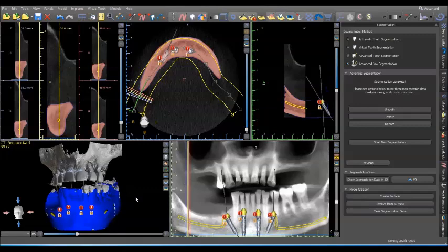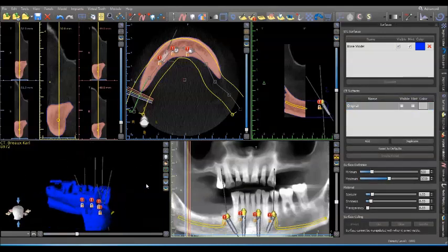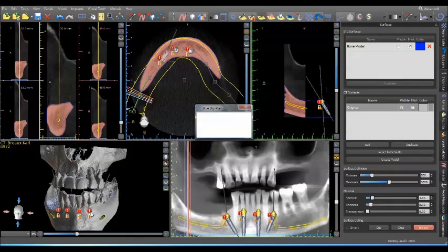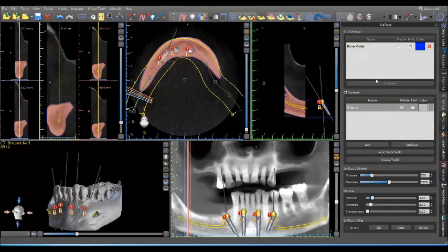So now you can see we just created it. Now if you go into surfaces, you can click off the STL, or you click off the DICOM, you can see we have an STL file of this. Another way of doing this, something a little bit different, if you go into surfaces, you go into isolate, just isolate the lower surface. It's pretty easy to do. Then you just have this one file, and you can just say, hey, look, this file right here, whatever it is, a model, so just go ahead and create a model. And the software will also create a model based on that.